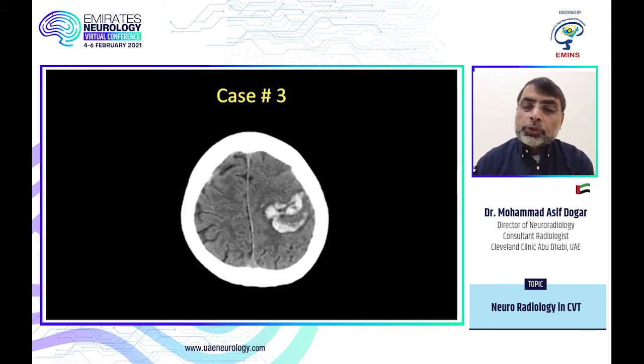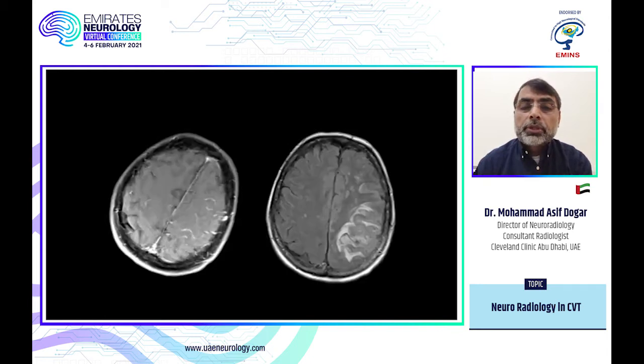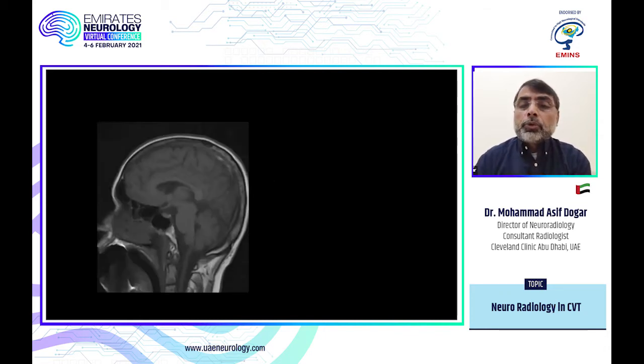Another case, on the same theme, there's a hemorrhage. Again, it is interrupted hemorrhage, normal parenchyma in between the hemorrhages. So this is highly suspicious of venous sinus thrombosis. MRI can be confusing. Actually, this patient has a breast carcinoma and they sent the patient to rule out metastatic disease. You can see edema here, and you can even see some leptomeningeal enhancement or vascular engorgement, which can easily be confused with metastatic disease. On the MRI, the images without contrast are very helpful.